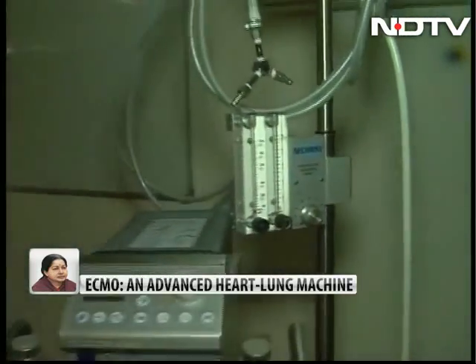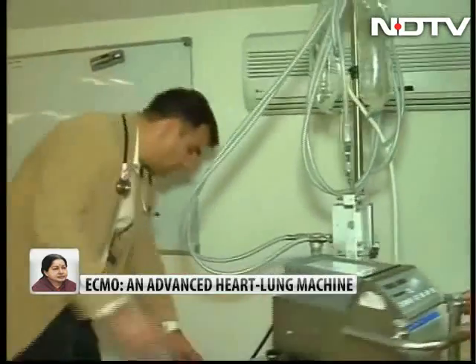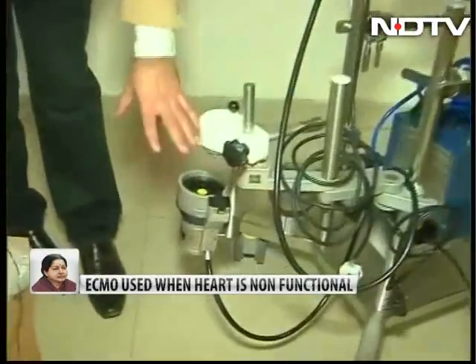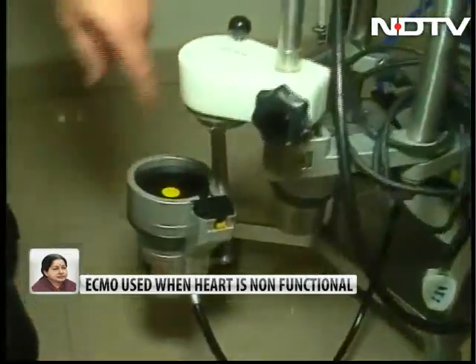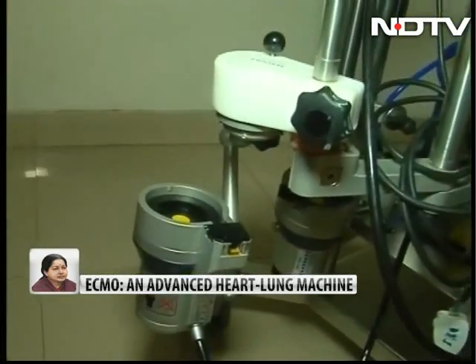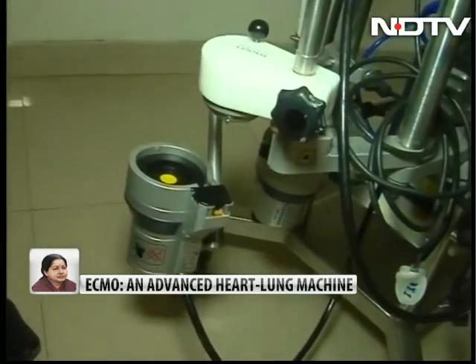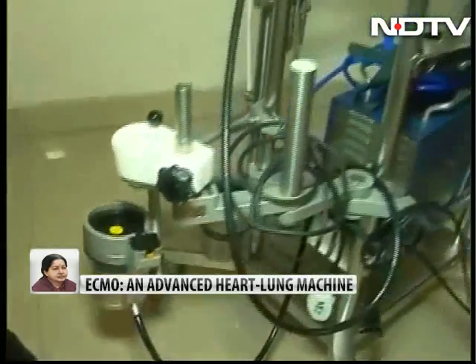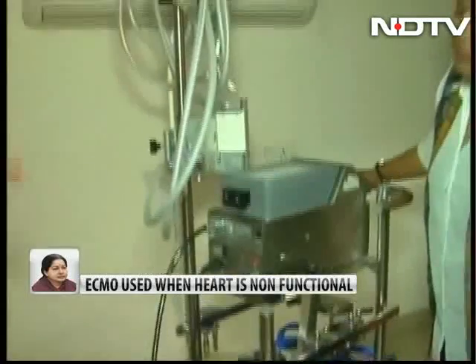If you come around, you can see this is a pump, and you can think of it as an artificial heart. This is a pump through which the blood flows, and the flow maintains the blood pressure, and that's where the ECMO machine is used. So this is the assist device which supports your heart and can also support your lung.